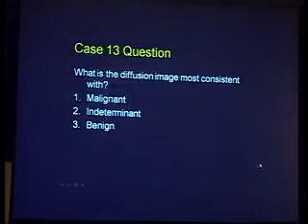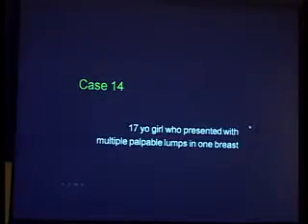That they're bright. And probably a long story to explain the physics, but in short, in cancers the histology of it is such that the water movement is more restricted, and the signal characteristics are inversely proportional. That means more restricted will look brighter, inversely proportional. So bright on diffusion tends to be more likely to be malignant, in a nutshell. Okay? So these are consistent with malignant. These were multicentric invasive ductal carcinomas in this case.